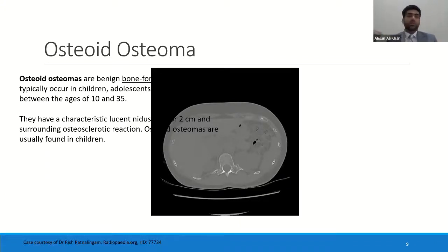MRI can tell you different things. For example, T1 can give you a very good understanding of the gross morphology of the tumors, the contour of the tumors, the boundaries of the tumors. T2 can give you good information on whether there is an epidural compression or not. But whenever it comes to the bone, for example, we want to see whether the lesion is lytic, blastic, sclerotic, whether the cortex of the bone has been compromised or not, you need a CT scan. That's the best way when we are looking at these characteristics of the bone.